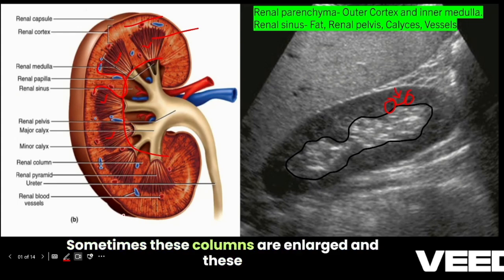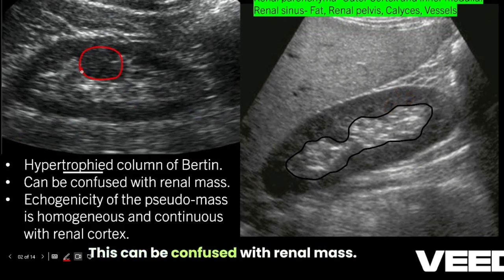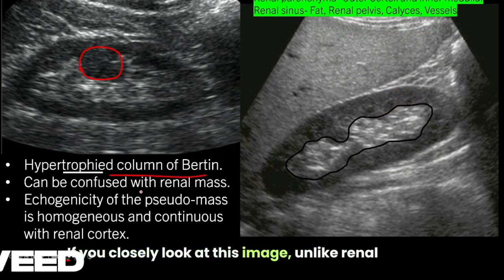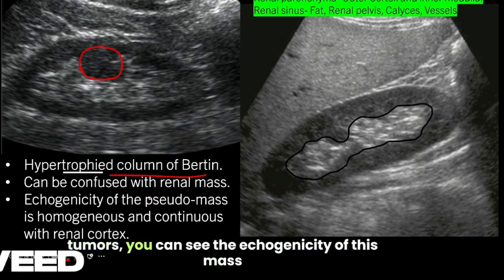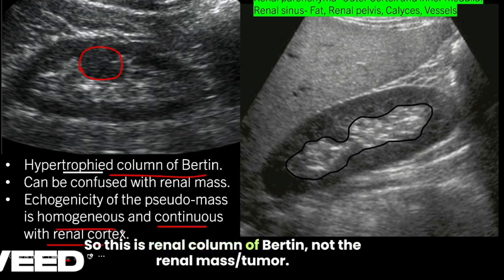Sometimes these columns are enlarged and these are called hypertrophied columns of Bertin. These can be confused with renal mass. If you closely look at this image, unlike renal tumors, you can see the echogenicity of this mass is homogeneous and continuous with renal cortex. So this is renal column of Bertin, not the renal mass.